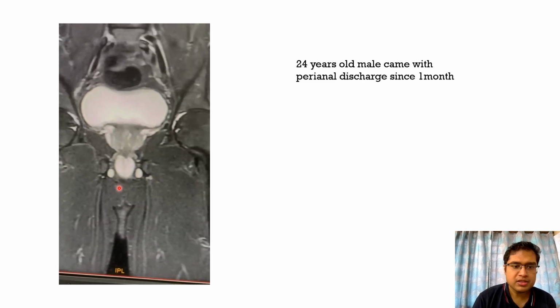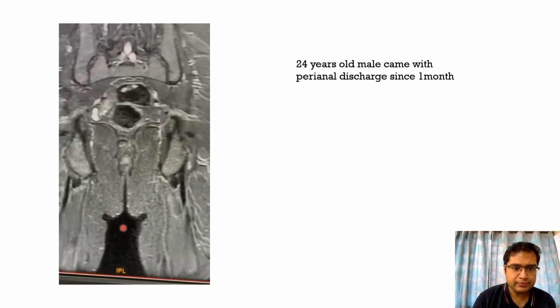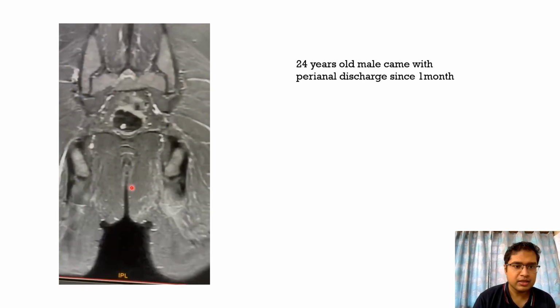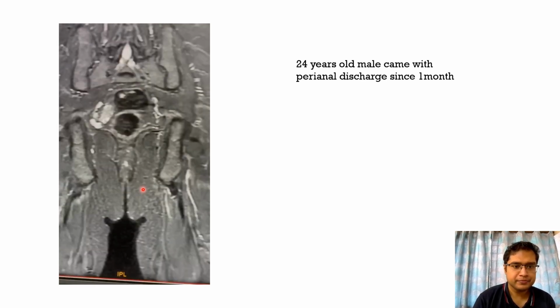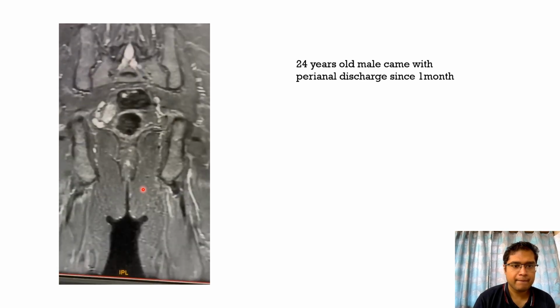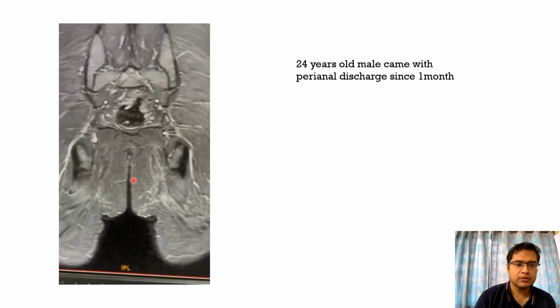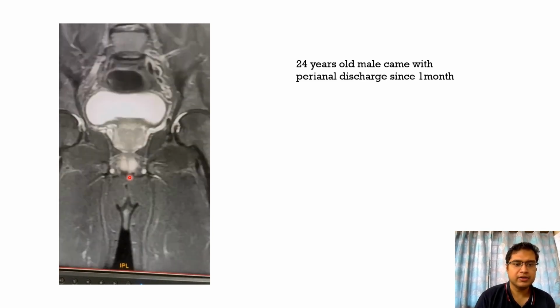These are the coronal images, where we can see that this tract is seen in the intersphincteric plane. This is the tract that is seen in the intersphincteric plane.